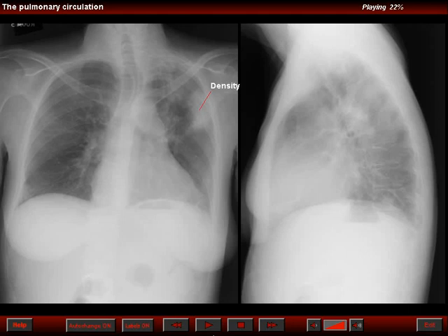The differential diagnosis would have to include a pneumonia, a pulmonary hemorrhage, a neoplasia, and in this case, because of the history, pulmonary embolism had to be suspected because the density in the lung is out of proportion to the patient's symptoms. In other words, a pneumonia of this appearance should not produce a severe progressive dyspnea.